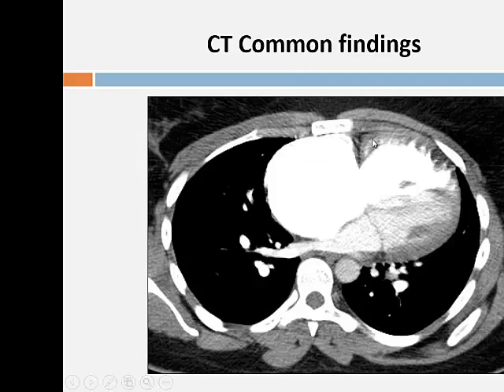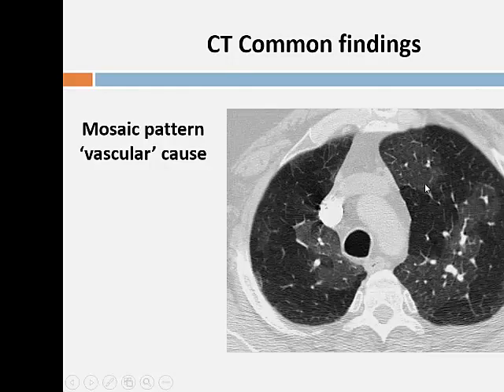So again, you're looking at the right heart, you'll look for right heart hypertrophy, you can look for septal flattening, as Taryn's already shown you. Looking at the lung parenchyma, what we traditionally look for is this thing called mosaic attenuation. We see this not infrequently in radiology, and often the dilemma is, is it air trapping? Is it not air trapping? What's the etiology? Is it the black lung that's normal or the white lung that's abnormal, or vice versa?